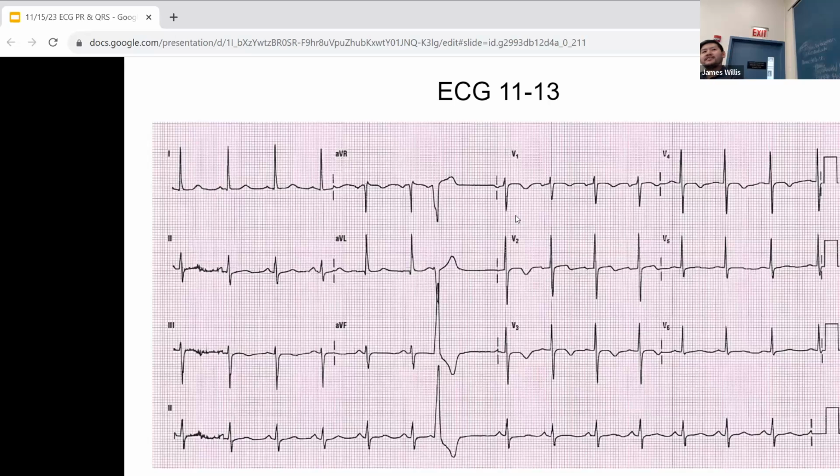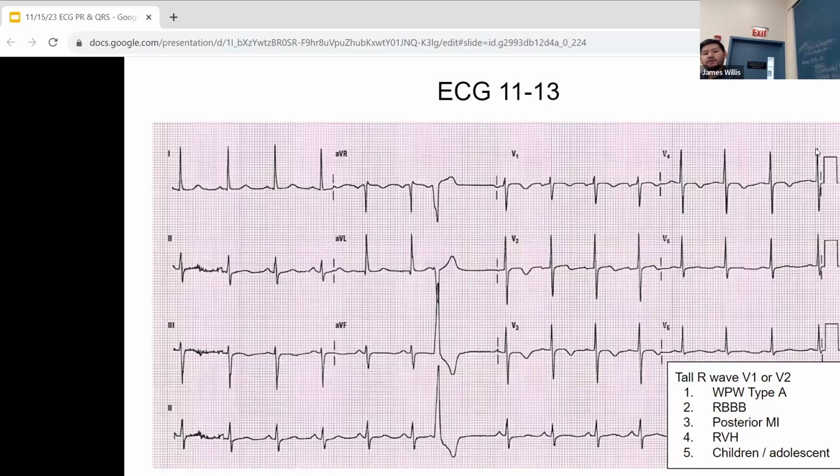Displaced leads. What if this patient had really bad chest pain? Could be Wellens. PE. So this patient has right ventricular hypertrophy. This is kind of a strain pattern, in that there are T-wave inversions in the anterior leads. Sometimes you'll see right axis. So make sure you go through your differential.